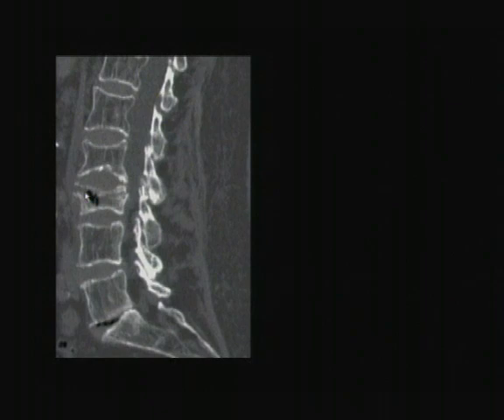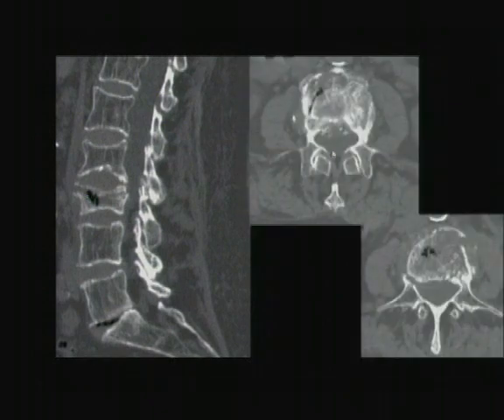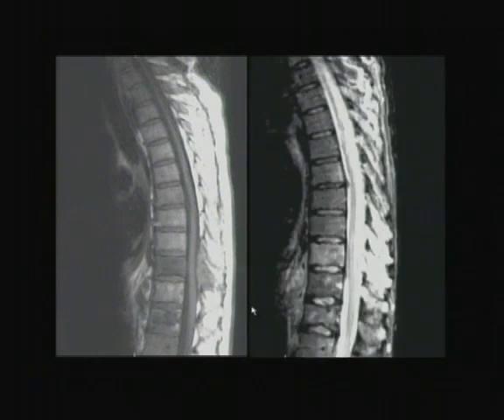If you see air in the vertebra, again, this is a benign collapse. You can ignore it or watch it for more collapse. If you see more than one hit, like here and here, and if the collapse gives you a posterior bulge like you see here, rather than just a retropulsion of the superior upper corner, then it is metastasis. So two hits or more than one hit, it's metastasis. If you see the posterior elements involved in addition to the body, another hit here, this is metastasis.